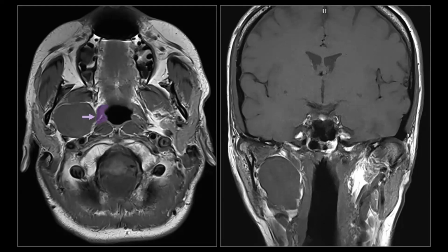Let's take a closer look. We see here the pharyngeal mucosal space, which is a bit displaced medially. We see here the carotid space, which is a bit displaced posteriorly. The parotid gland is displaced laterally, posterolaterally, and the masticator space is displaced anteriorly. This means that a tumor must have arisen between these respective spaces, and what do we find there?